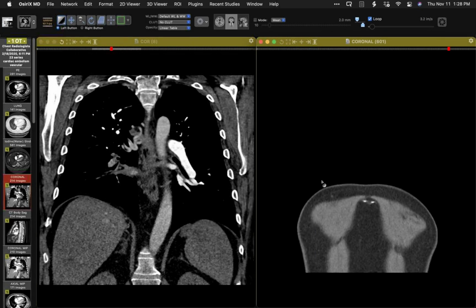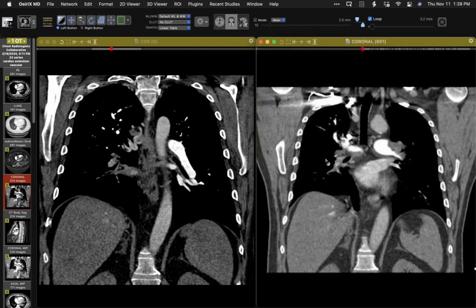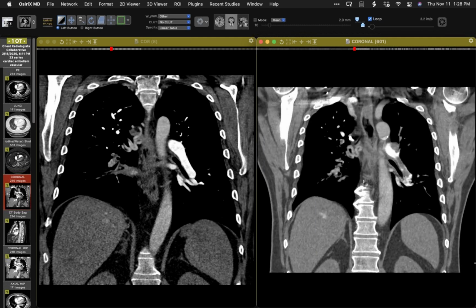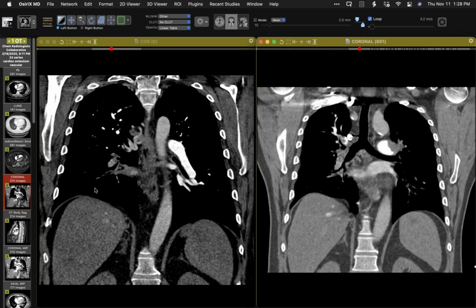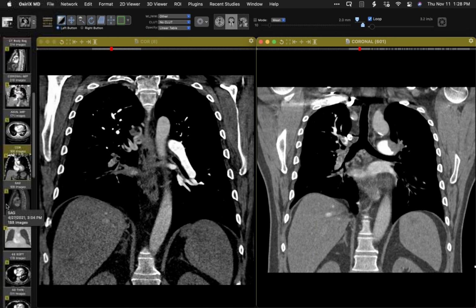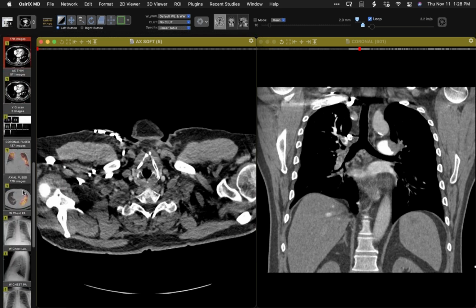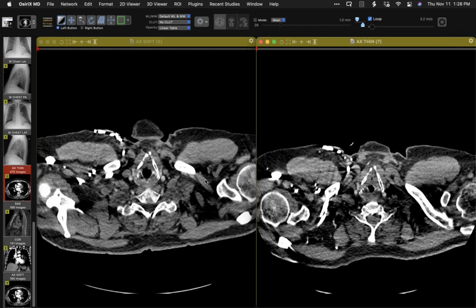Now I'm going to go back in time to, I want to see if I can get my time right here, 2020. And here's a CT from then. And you can see the clots in the vessels. Already we have bronchial arteries even back then. So we have that diagnosis. And then what I want to show you last of all is a comparison between before and after. So I need to get my timing right here. Before and after surgical thromboendarterectomy.